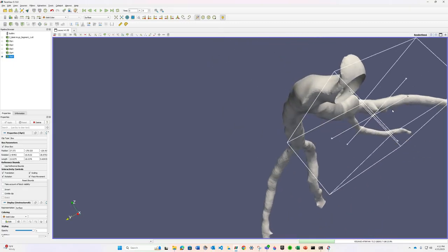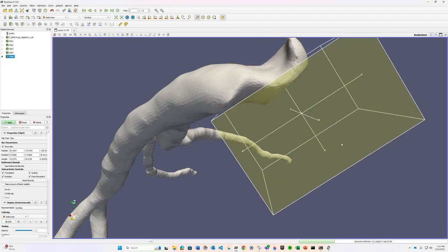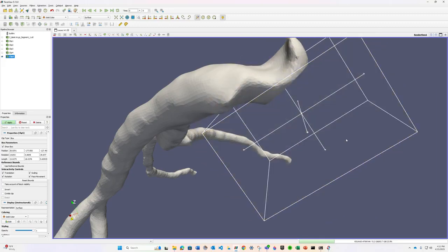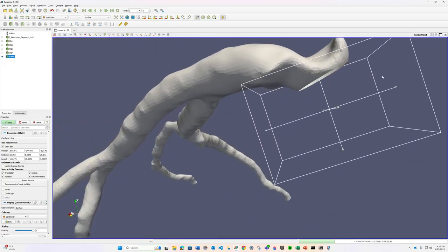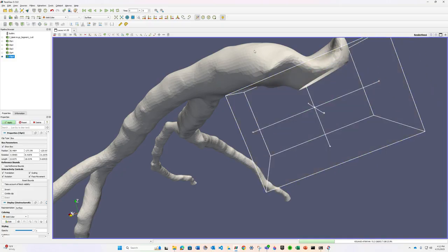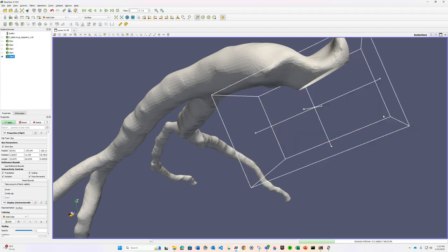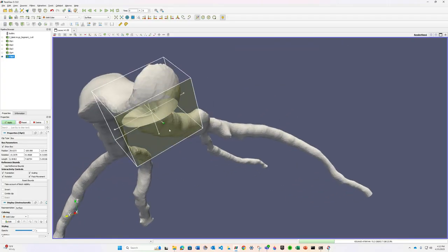So what I would do in this situation is this. I would line it up really close, rotate a little bit more. Yeah, this whole curvature is not something you would typically see, so it's okay to get rid of it. But if you had something where it was round like here, you would line it up to where it's just like there, wherever you feel the opening is. But for this one, we can kind of cheat and put it right here.